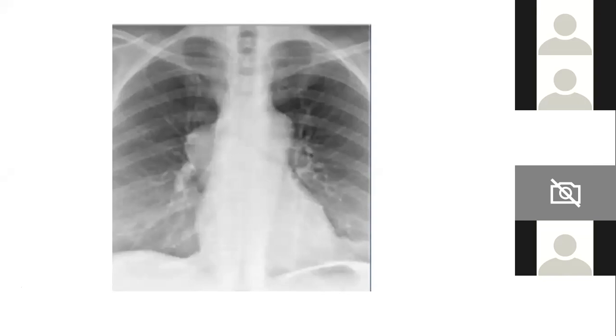Where is the lesion? Okay, good. So what's happening here is there is a lesion which is projecting.